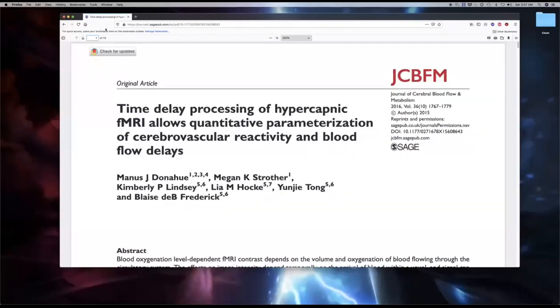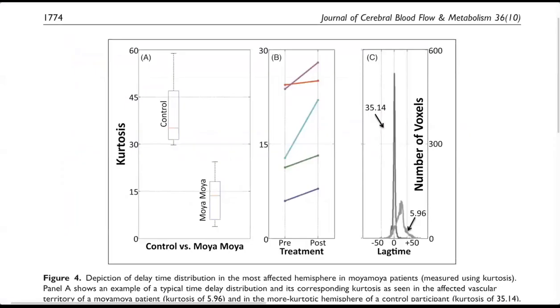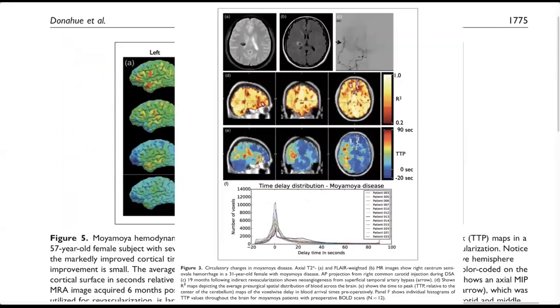And that actually concludes the tutorial. I hope I have given you the tools to look through the output of Riptide in a clinical population to get a sense of how to navigate these results. I've shown you where to find and how to extract and look at the lag distribution, like figure 4, the lag map results, which we published in figure 5, which we saw through standardization as well as normalization, and lastly the R-square maps or variance maps. You can now go ahead and look through the data, find different ways to analyze it, and I hope you learned a little bit, and thank you for listening.